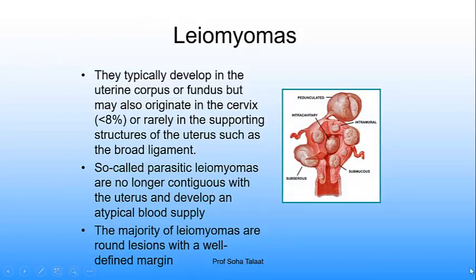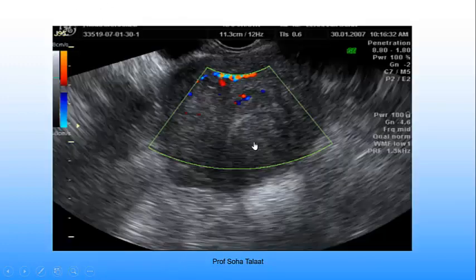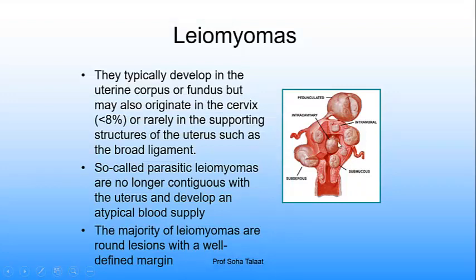This is the intracavitary leiomyoma. Here, this one, this is the FIGO stage 0, the intracavitary leiomyoma. And it has a pedicle, and usually, as we say, isoechoic to the myometrium in most cases, except if there are areas of degeneration and there is perifibroid plexus within.